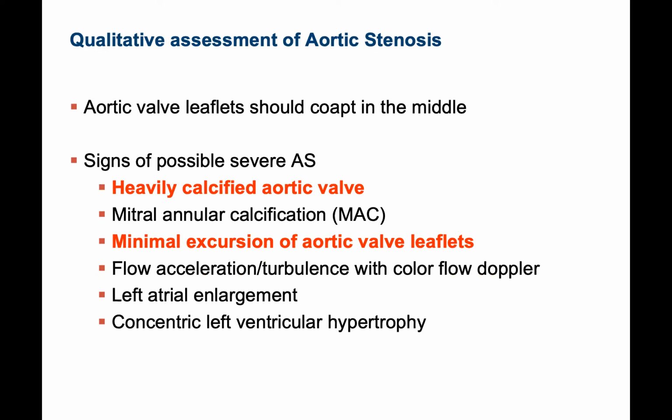The aortic valve leaflets should coapt in the middle. So basically, our qualitative assessment is just looking at the aortic valve. Does it open? Does it close? When it closes, do they come together in the middle? Do the valves open all the way?